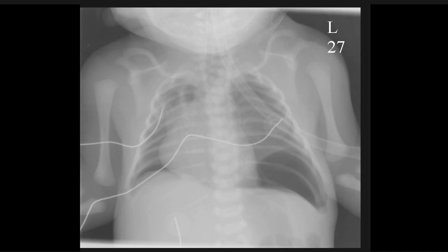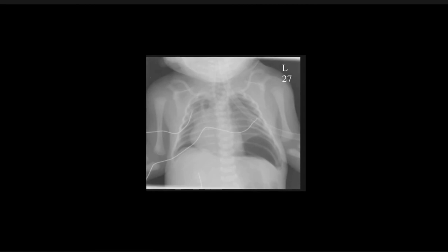Now here's another case, same situation. It's a pediatric case, obviously. And again, this is in a supine study. And we're going to compare symmetry. So zoom out. And there is actually quite a bit of lucency there on both sides at the bottom, especially if we compare top to bottom. That bottom part is much more lucent.